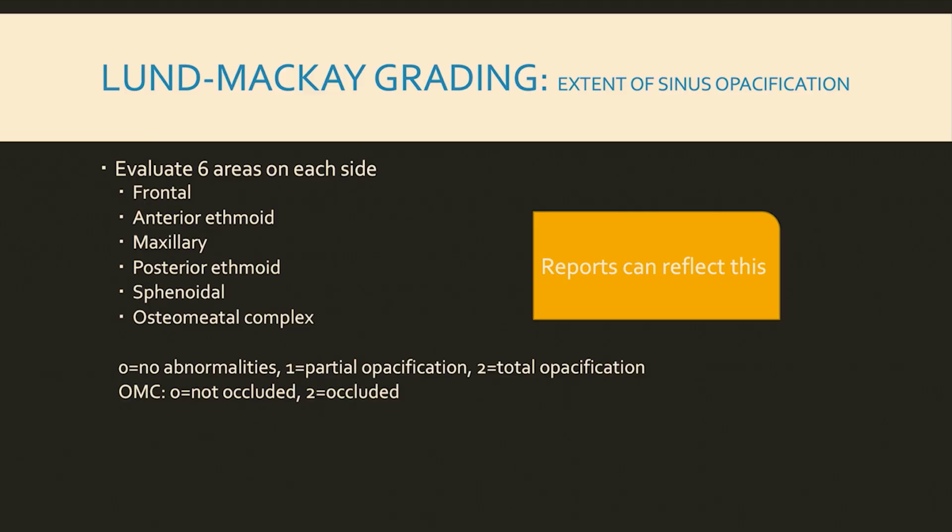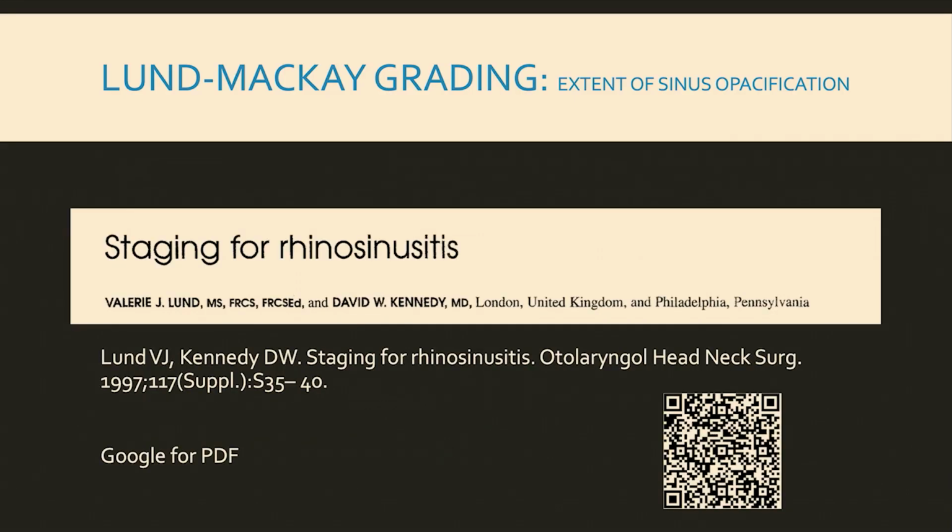The one caveat here, guys, is you can have circumferential mucosal thickening of a lot of sinuses, and I'll mention that. If it's polypoidal, you want to mention that. If it's polypoidal mucosal thickening, because now you're leaning towards one of the most common diagnoses, which is sinonasal polyposis for ENTs and sinus surgeons. So if it's just nice linear mucosal thickening, I'll just say circumferential. If you're starting to see polypoidal stuff, that's worth mentioning as an extra little morsel for them, because that makes a difference, okay? So don't worry about the points.